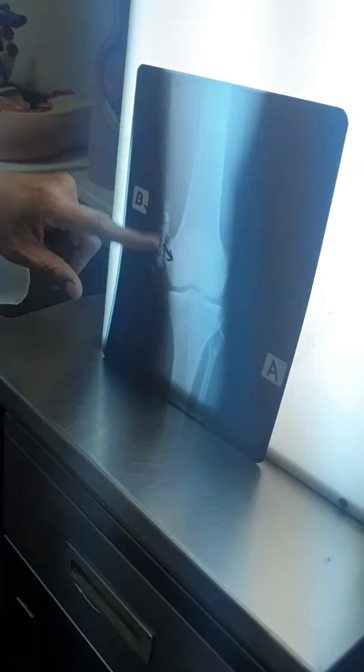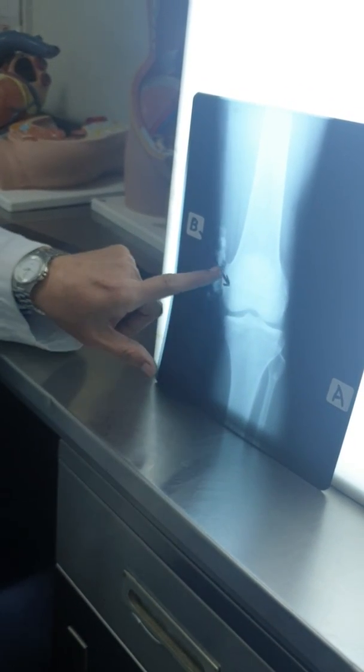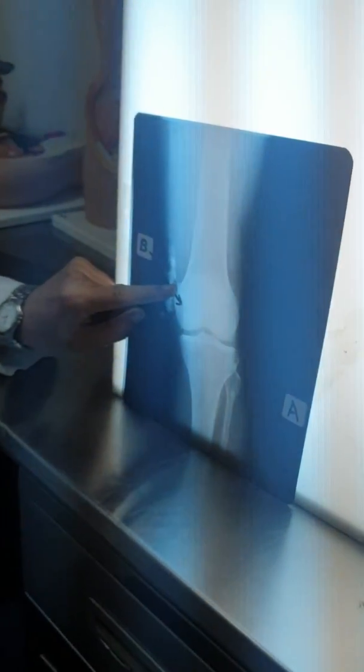Here you can identify the knee region and the lower half of the femur. This is the 2 epicondyles, supracondylar ridges. This is the adductor tubercle on the medial side. Above the medial epicondyle, you have a small tubercle from here. This is the last attachment for adductor magnus.